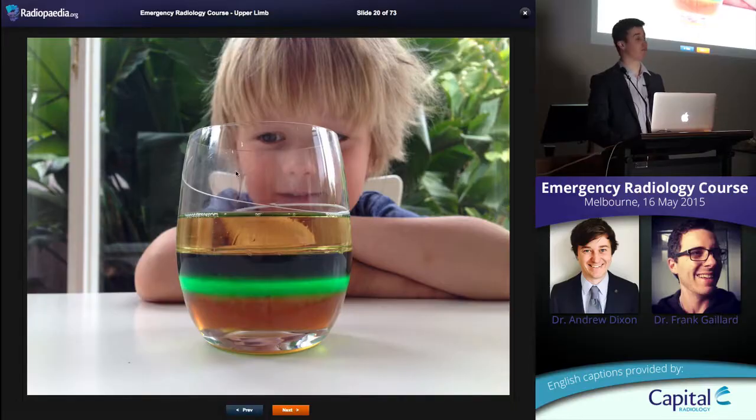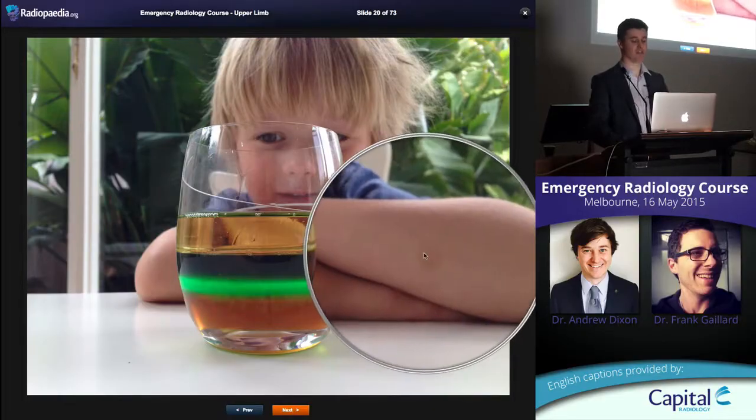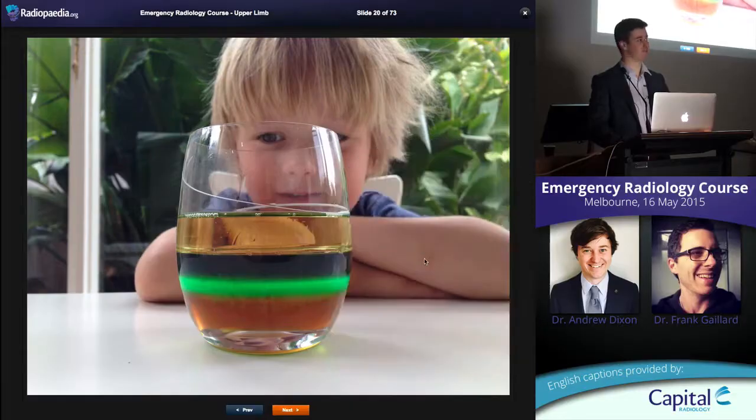Okay. There's also the other level to recognise here, the air fluid level, because that comes back when we're talking about the chest and the abdomen later on. Okay, so these perfectly straight lines in radiology, gravity, important to recognise. You'll probably spot there's a little bruise here. That's not a defensive bruise.